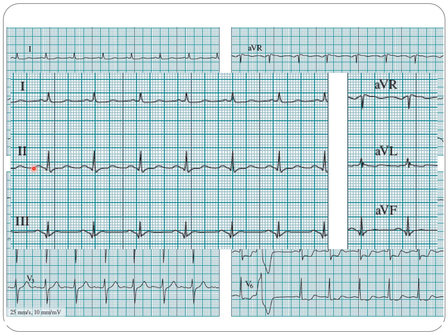The morphology of the P wave. The morphology that you should fit the P wave in one square or 1/4 of this big box. That's okay, that's fine. This P is fine. It doesn't have any kind of hypertrophy. Next, the PR interval. We are going to evaluate whether every P is followed by the QRS and every QRS is preceded with a P wave. Yes, it does. And the PR interval is constant and normal.